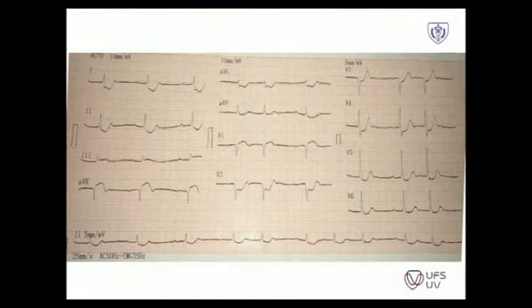Here's an ECG we received from a peripheral hospital, a gentleman with chest pain, and we saw that this ECG had ST segment elevation and ST segment depression on most of the leads. There was no single cardiac area that was represented. Looking at the inferior leads, standard lead 2, 3 and AVF, you see ST segment depression, elevation, and on the chest leads one sees that there's mostly ST segment depression.